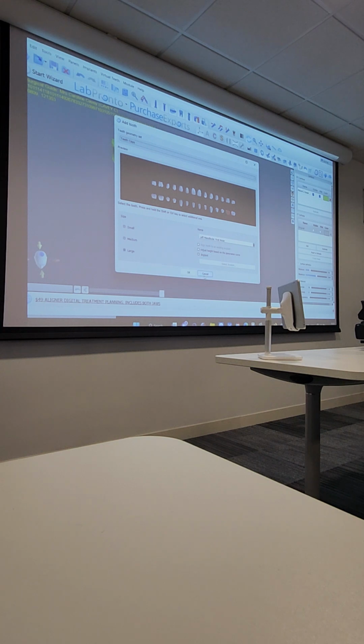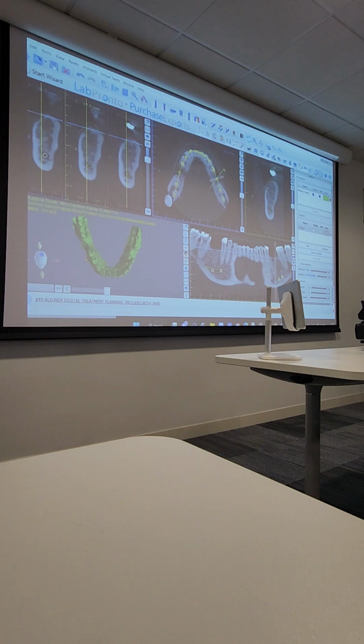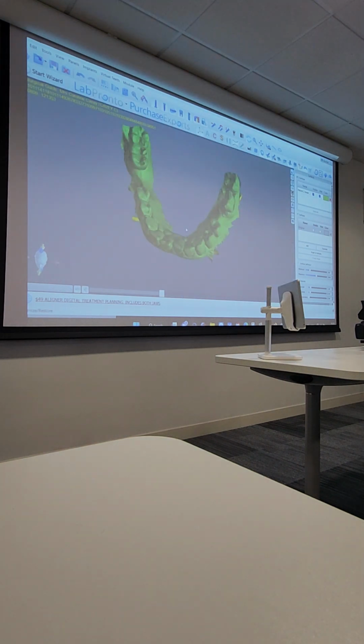Yes. Just lost us there. So once you've got, have you got this? No. Before that. Have you got rid of the big DICOM? So look here. I'm just getting rid of the X-ray there, the 3D X-ray. That's all I'm doing. Now you got the green there. You maximize that window so you can work on it. And what do you want to do?